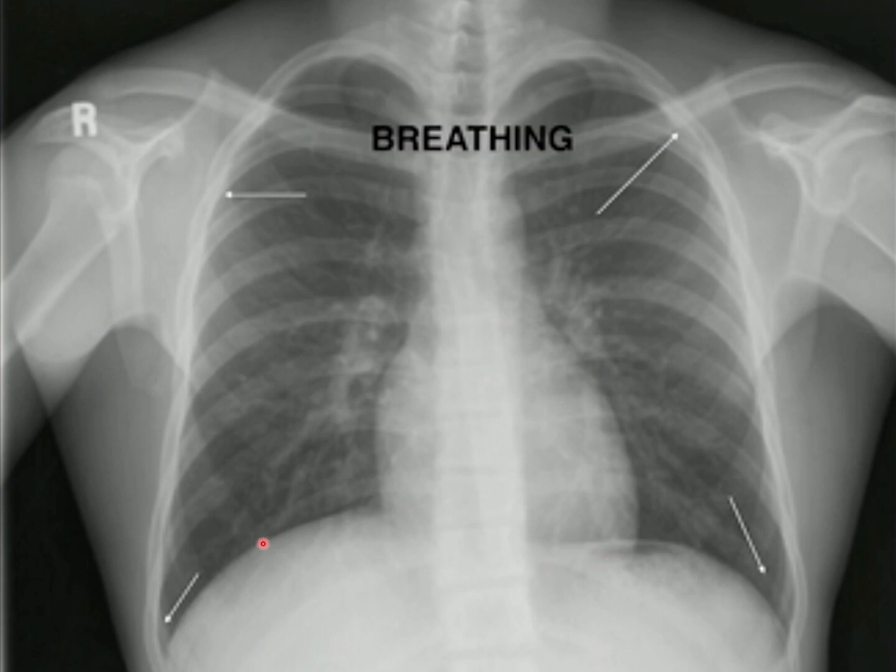And also, if the patient is having a pneumothorax in trauma setting, mostly he is going to be lying flat on his back or her back. So you are not going to be able to see the pneumothorax easily in the early phases of the pneumothorax. And the only sign you are going to find is a deep sulcus. If you find in one side that this is very deep in comparison to the other side, this might be the only clue you have for pneumothorax.